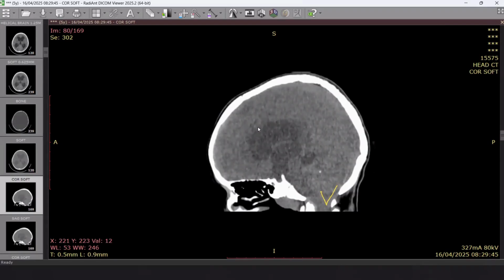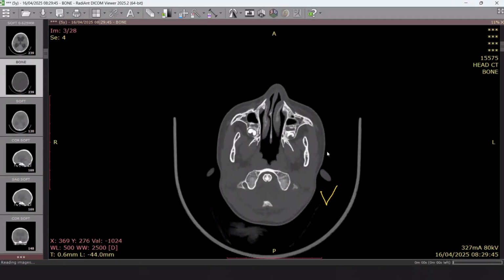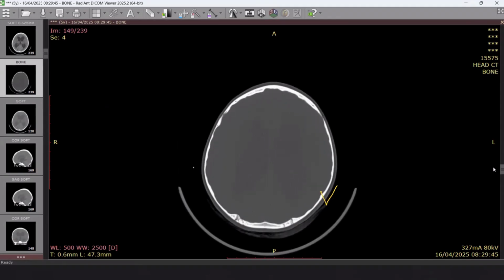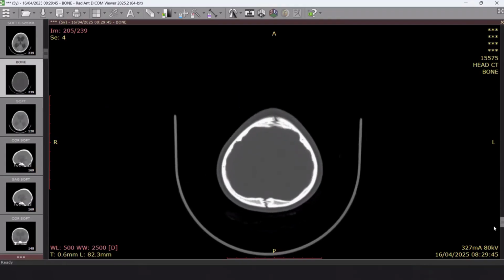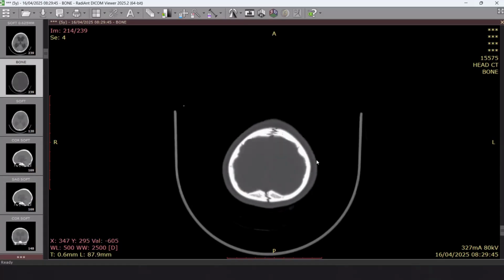What's your diagnosis, differential diagnosis? What is the next step? Next step, is there an MRI study for this child, doctor? I agree with you, but really, I don't have an MRI study because it was an emergency situation. This study only, because we did this one in the emergency room, and I think the patient was transferred to a neurosurgical center. I would also like to emphasize that we have here diastasis of the sagittal sutures because of increased intracranial tension.